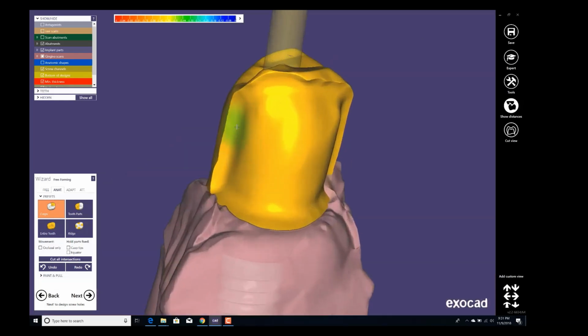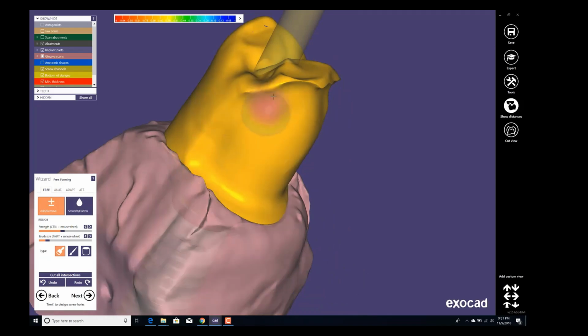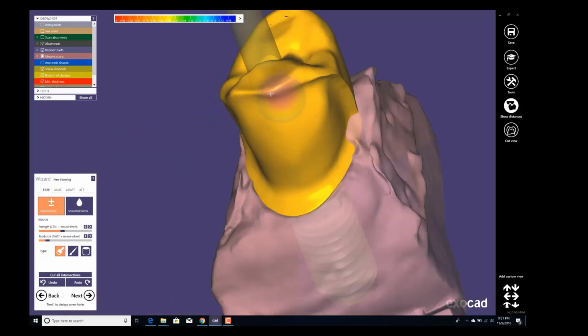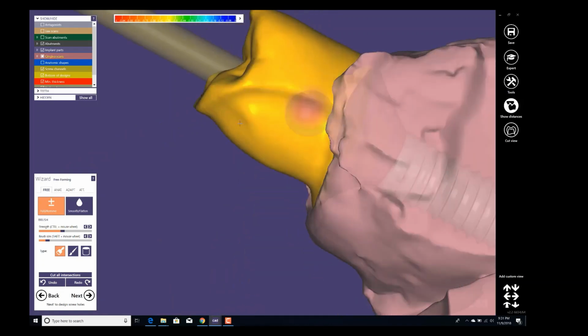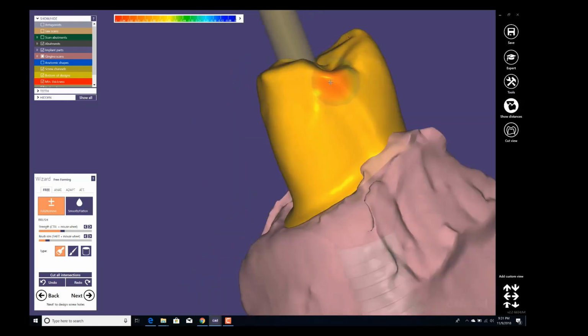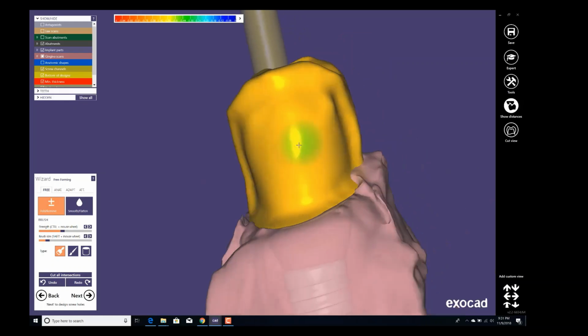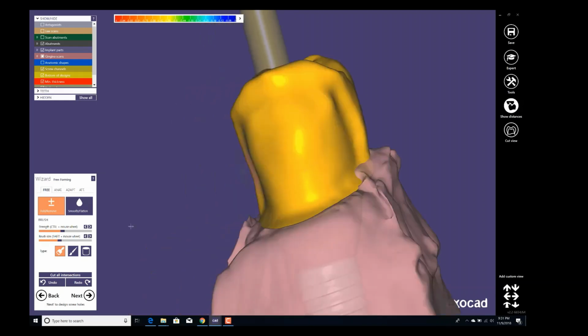And here we will do our final touch. We are going to smooth again by clicking Shift and Control. We smooth. If I click just Shift, I'm removing, and if I click nothing, just the left button of the mouse, the brush is green, so I'm adding. Keep that in mind.